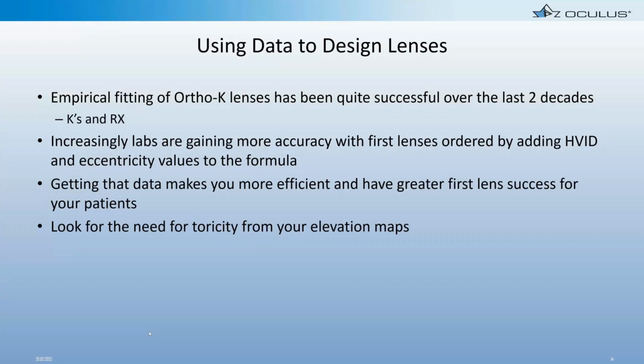So those are some of the benefits of the Pentacam when it comes to the pre-lens design process. It's giving us full corneal data. It's giving us true corneal data. It's giving us non-tear layer dependent data, and it's also screening out those patients that may not be good candidates for Ortho-K prior to fitting.